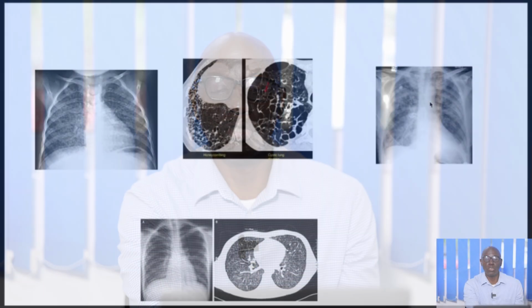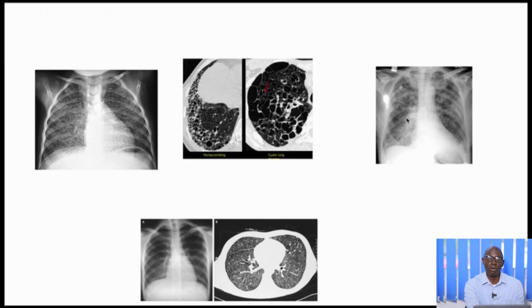For example, if you attempted to write a short report on this image, it's clear that basically we have linear or reticulolinear infiltrates, which are predominantly in the mid-zone, more marked on the right. Okay, and then here we can say this is an interstitial type of infiltration. The nodular one may be miliary tuberculosis, and of course we also reviewed the bronchiectasis.